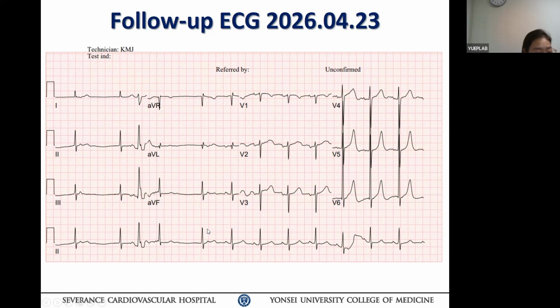So you mean this beat? Yes. The RR interval is very regular, right? Yes, it's regular like the normal rate. This is clearly from here on a sinus rhythm.